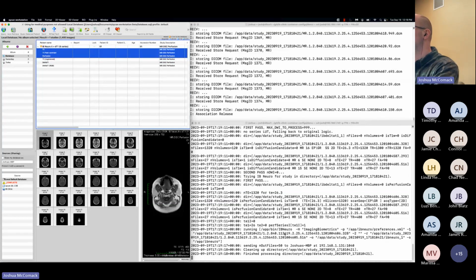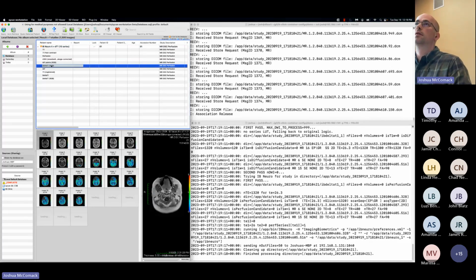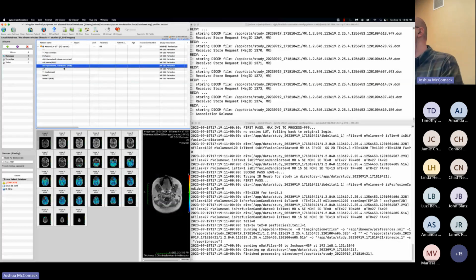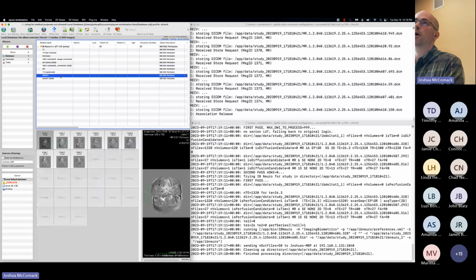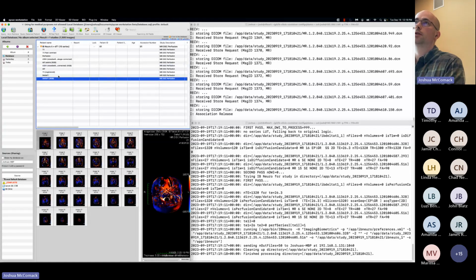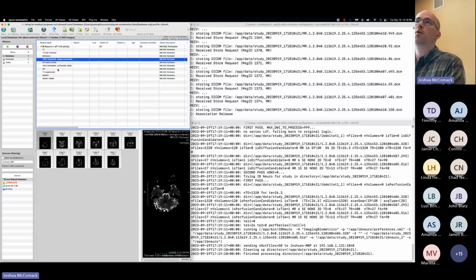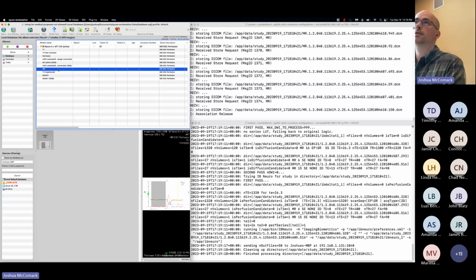And it already processed the Delta T1 and IB Neuro data. We can see that Delta T1 already came back to us, as well as the IB Neuro output, which in this case is the RCBV maps. Currently I have this configured to output both the RGB and grayscale, or quantitative, outputs for Delta T1, and RGB and grayscale RCBVs. Now there's additional output as well for quality assurance, such as AIF curve output.